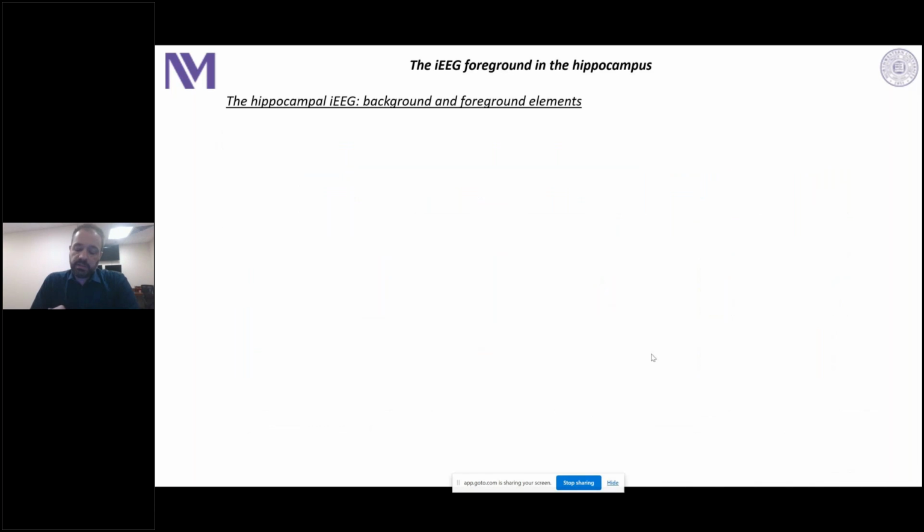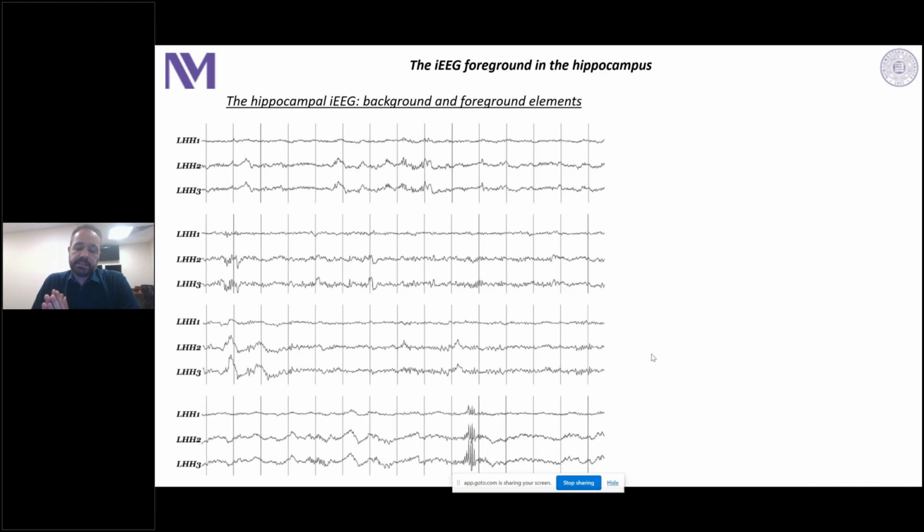So now, in order to summarize everything and go down into those criteria that I have set through my experience into what constitutes the normal and abnormal patterns in the hippocampus.